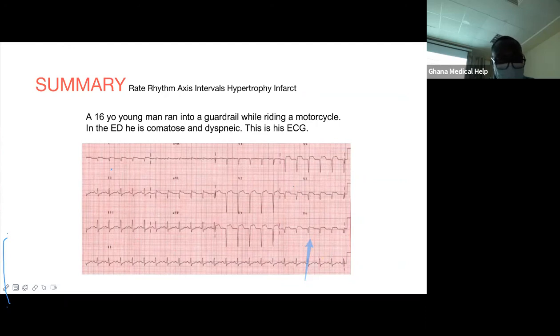So the take home is that beware that it's not only those who have hypertension or diabetes or any of those diseases that are the only candidates for ischemia or infarction. Coronary artery injury can, on rare occasions after a blunt chest trauma, occur. Like Dr. Jaula said, if you look critically, you realize that there's a 2 millimeter ST segment elevation, right from V1 actually. It's not so discernible there, but if you go to V2, it's there. So from V2 to V6.